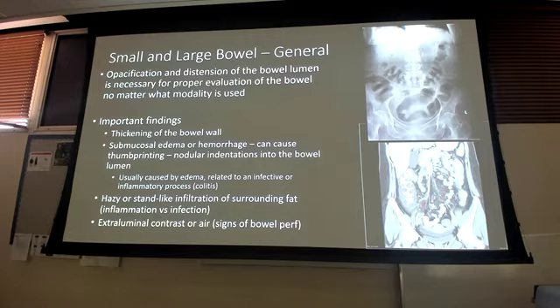That's what's called stranding, fat stranding, okay? What that is, is inflammation. They are hazy, strand-like lines around an organ that might be inflamed. You can kind of see it around here too. See some of it in here, in between these organs. That is a sign of inflammation. You'll see it commonly around the pancreas when the pancreas is inflamed. We'll look at some more pictures of that as we go on.